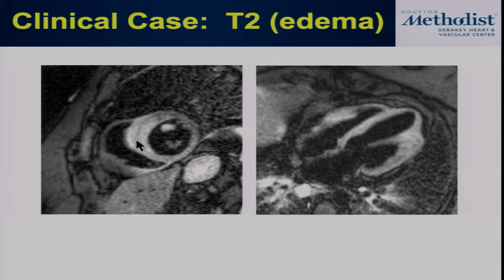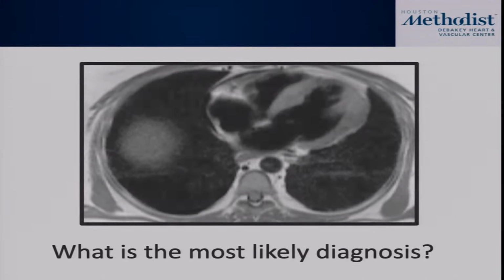So this is an area of acute injury to this area. And obviously this would not fit a coronary artery distribution, so this looks like a scenario where you've got acute myocardial injury or myocardial damage from some process that's affecting the septum, the lateral wall, and the RV. So when you think about this, already some things should come to your mind. I'm going to make it even easier for you because I'm going to show you one additional set of images.